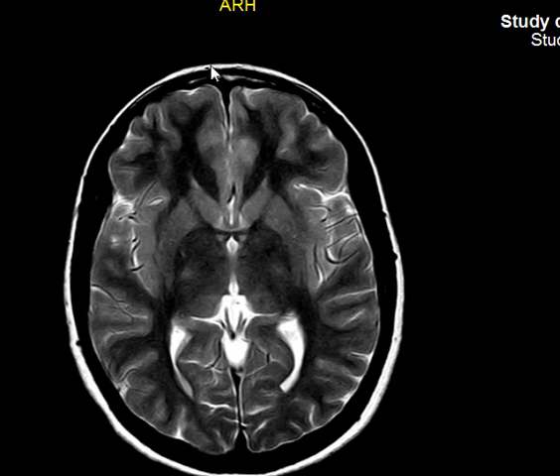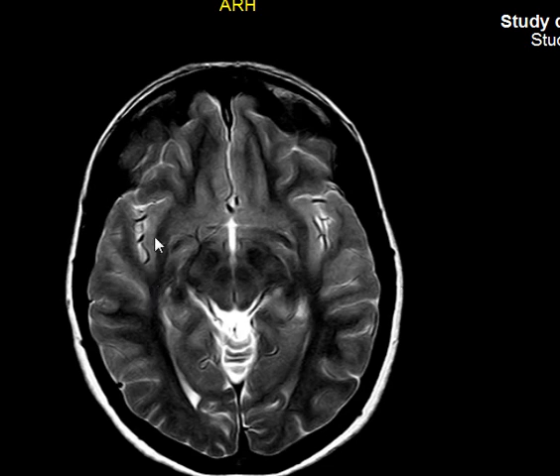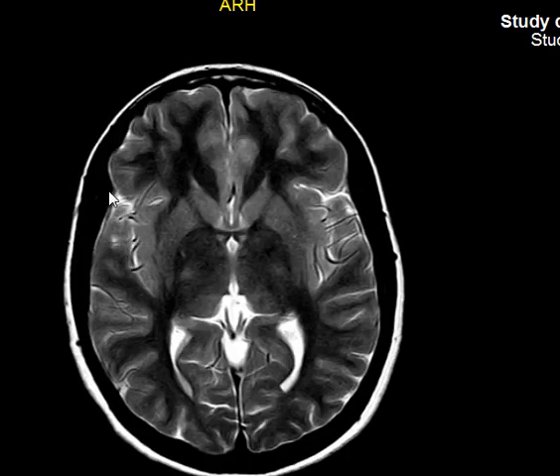Okay, you can see the frontal lobe here gives a cover to the insula. The parietal gives a cover to the insula, and if you go more inferiorly, you can see even the temporal part is sending an operculum or a cover for the insula. So the insula will be covered inside by overlying gray matter, opercula. That's the temporal, parietal, and frontal. Okay? So far so good. Any questions? Good.